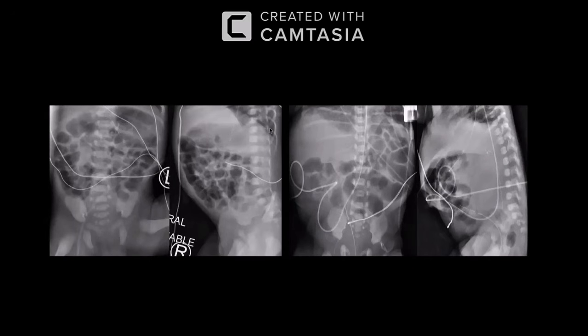In my normal practice, I would zoom the images to look for pneumoperitoneum, air within the liver. Other than that, in these images I cannot see free air. I'm trying to look at the mottled lucencies, which I am not able to appreciate.